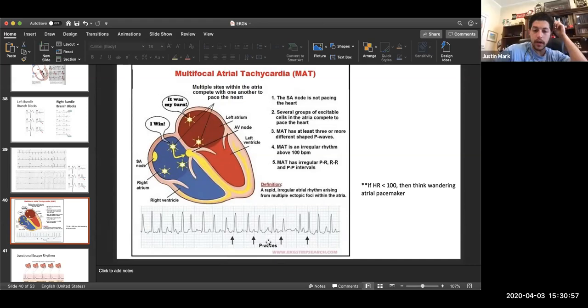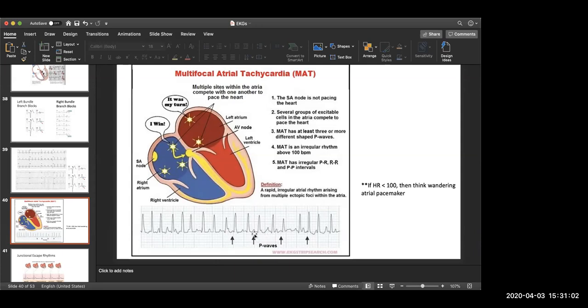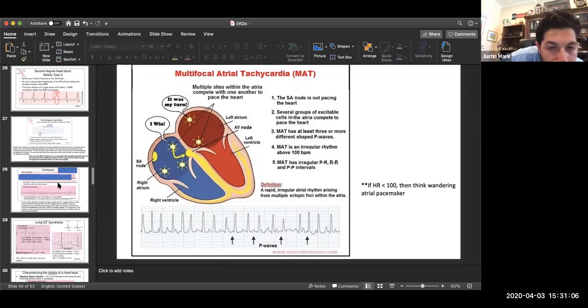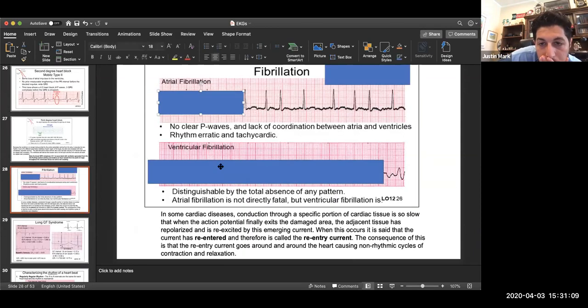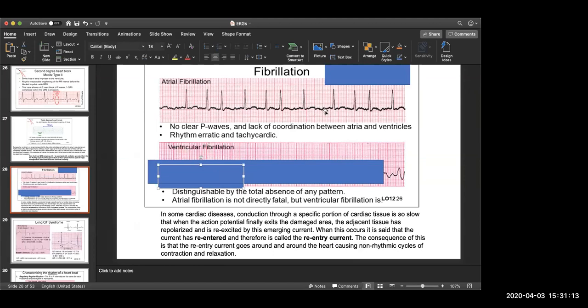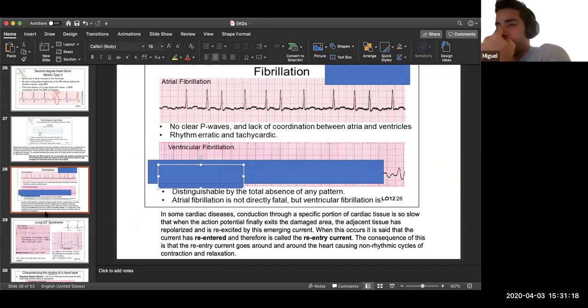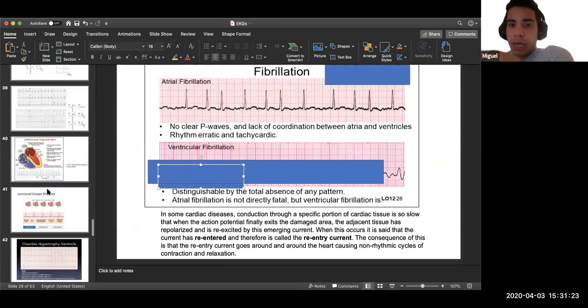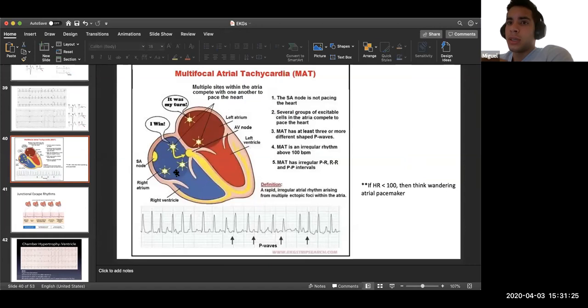Good question. So here we actually have P waves, right? You won't see them in AFib. If I go back, these are not P waves. These are fibrillatory patterns. They look like P waves, but they're not. Also, something very important she mentioned: when this question popped up, I thought it was AFib, but if you could see the entire lead for this, and then you go to see the chest leads, you can see the clear P waves, while you cannot see that in AFib.